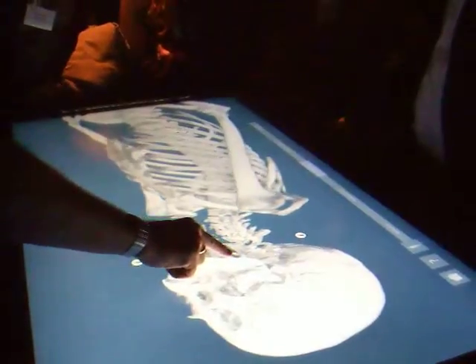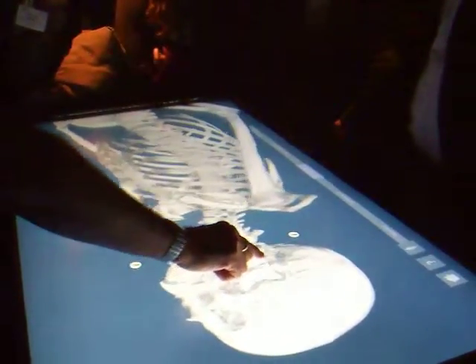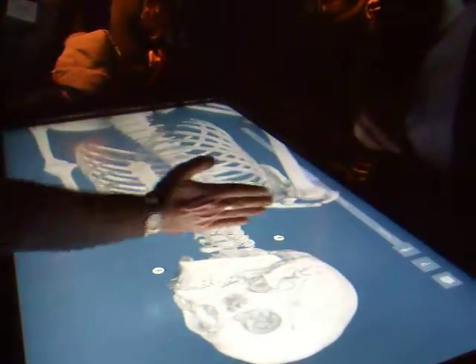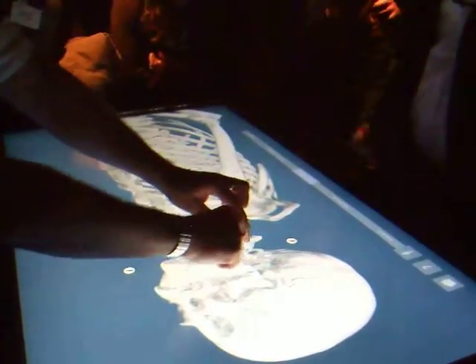If you rotate it around, you can see there's a displacement here. The bones are clearly not quite lined up the way they should be. Which ones? Just through here. The trachea? It's just there. You can see there's a displacement.